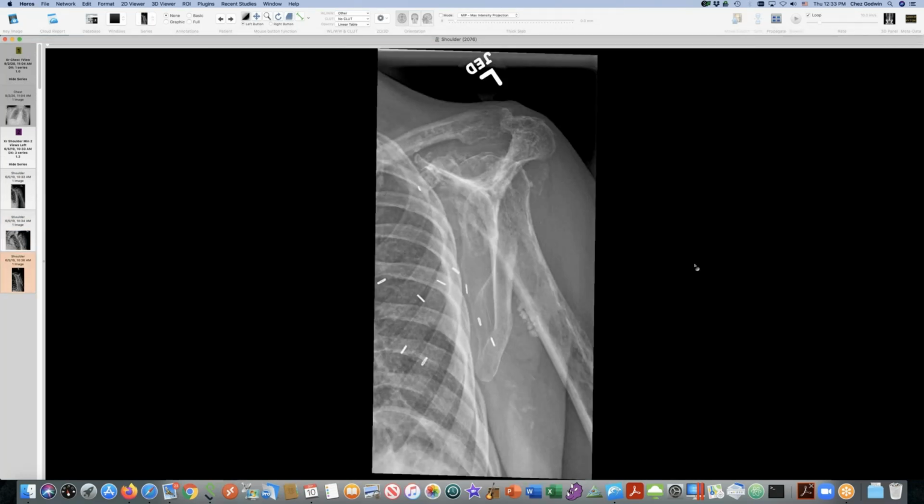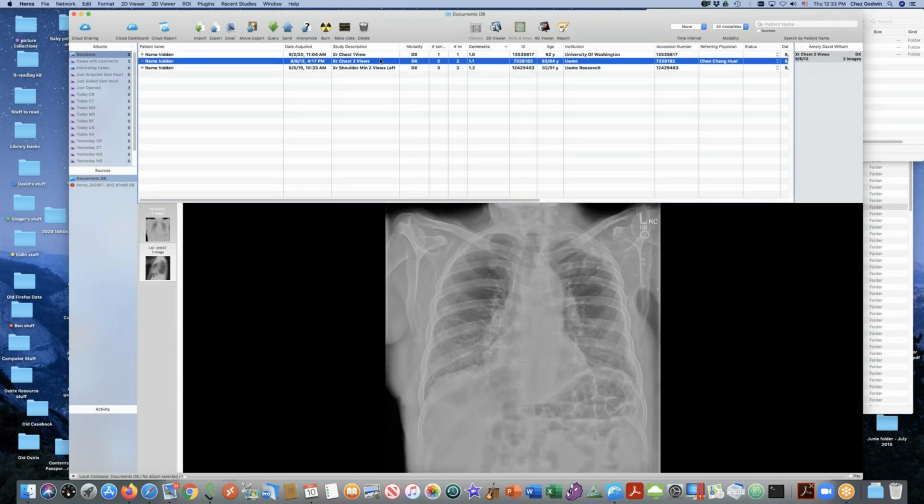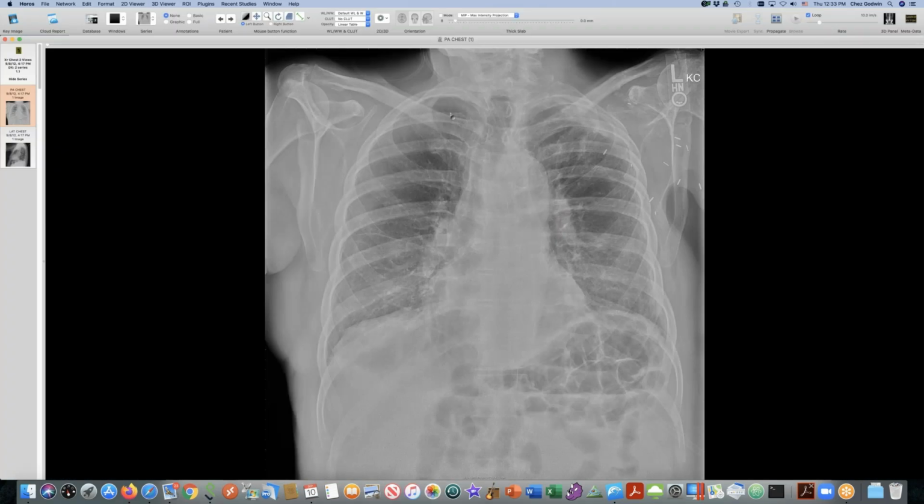Looks pretty bad. And then we have an earlier radiograph here from, I think, 2012. So this is many years ago. At this point, the bones didn't look so bad up here, but we did have this scarring in the lung.